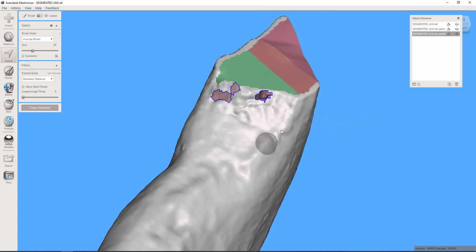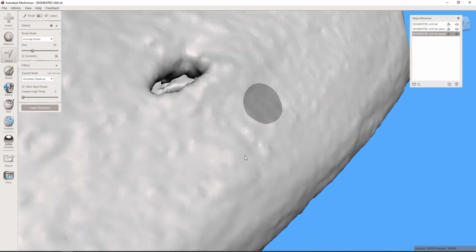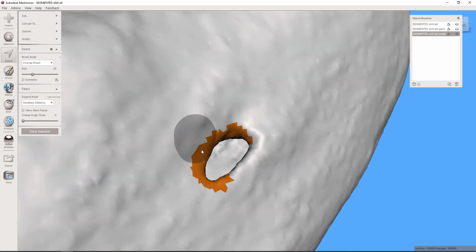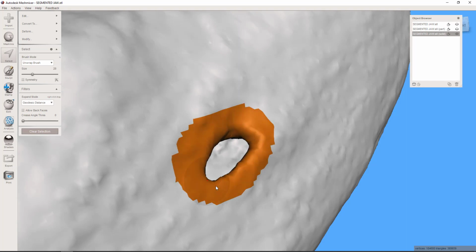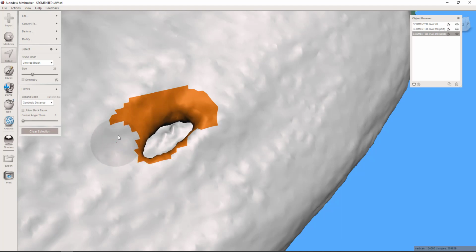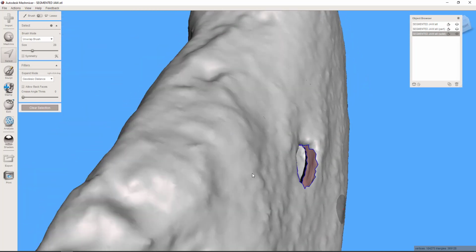Okay, so I'm going to keep finding any little errors like that and deleting them. This is obviously a problem up here where this is connecting in, so easiest thing is just go aggressively around it, and now just erase back right to the level of that framing. Delete it. That should have disconnected the inside and the outside, as you see there.